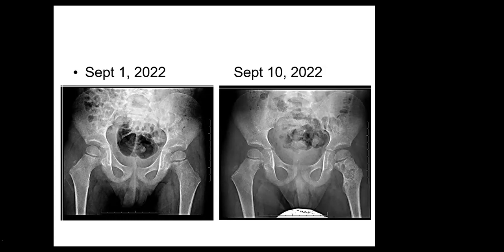And there is decreased bone density with abnormal destruction of the metaphysis associated with a hypodense lesion and there is cortical destruction. Mainly, there is no obvious periosteal reaction, no obvious soft tissue mass.